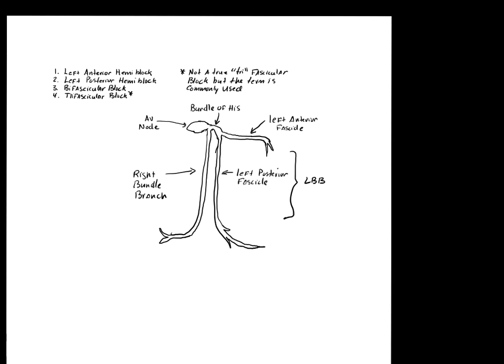Okay, so this is going to bring us to talking about fascicular blocks. And to have a discussion about fascicular blocks, we need to understand what bundle branch blocks are, and we need to understand how to determine the axis, because axis determination is a big part of identifying fascicular blocks.